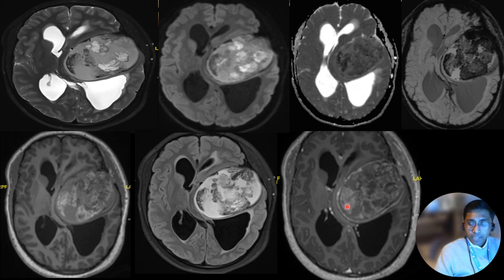It's very important in the pediatric age group, and in neurology and radiology especially, that we check all the sequences we have available with us. If you just look at the first and the second sequence on the bottom and the first and the second sequence here on the left, the diagnosis can easily be made. We don't even have to look at all the other sequences.